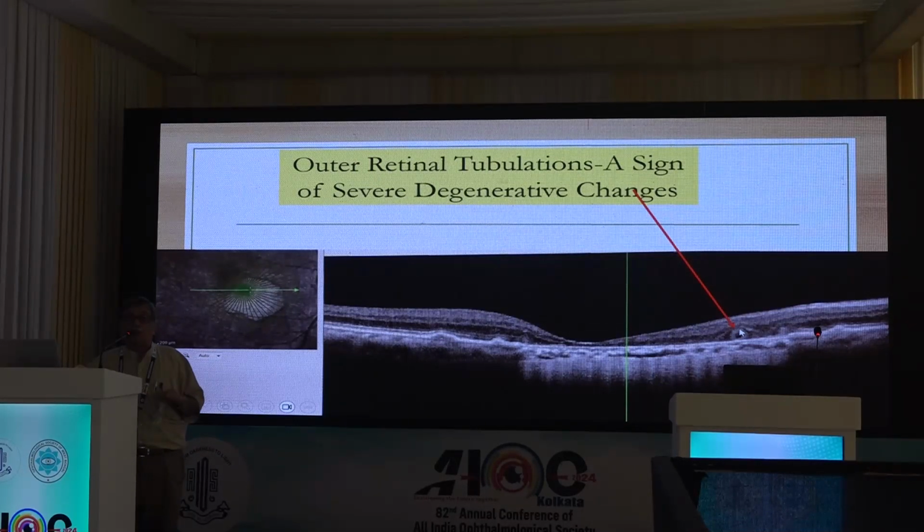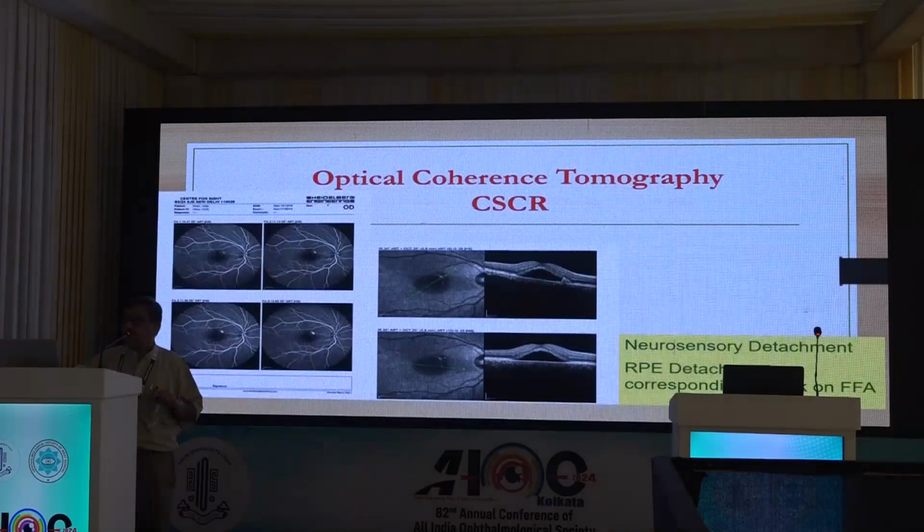This is what we call an outer retinal tubulation. Don't start treating these lesions. They don't need any treatment. It's a sign of severe degenerative change.